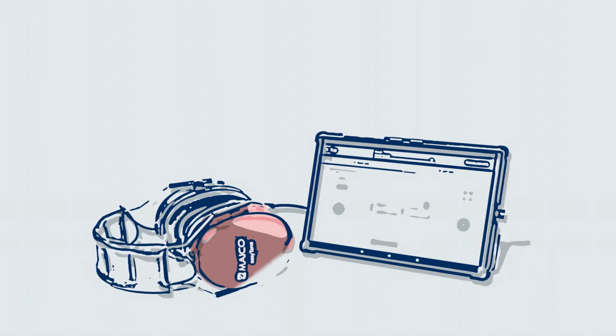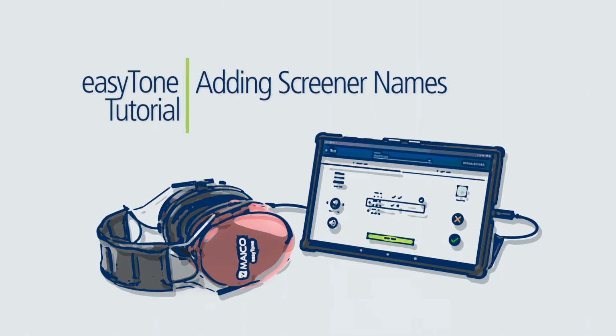This completes the tutorial on how to add a screener to the easyTone app. Please continue through the tutorial series for additional easyTone instruction.